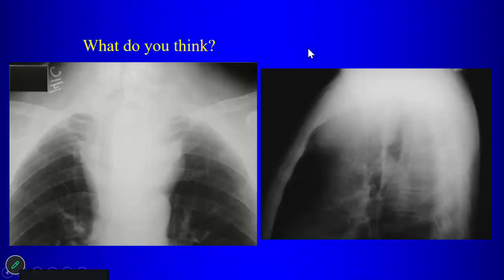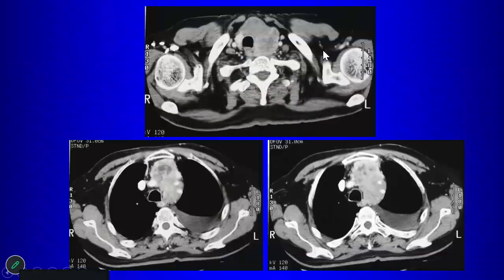So again, here you know the drill. What do we have? Anterior mediastinal mass. Yes. What's it doing? There's a tracheal deviation. Right. There's tracheal deviation towards the right. Okay. Here on the lateral view, you can say it's in the anterior mediastinum. Again, notice cervicothoracic sign there, the lateral border we don't see above the clavicle. So in your differential diagnosis, you will start with thyroid mass, right.